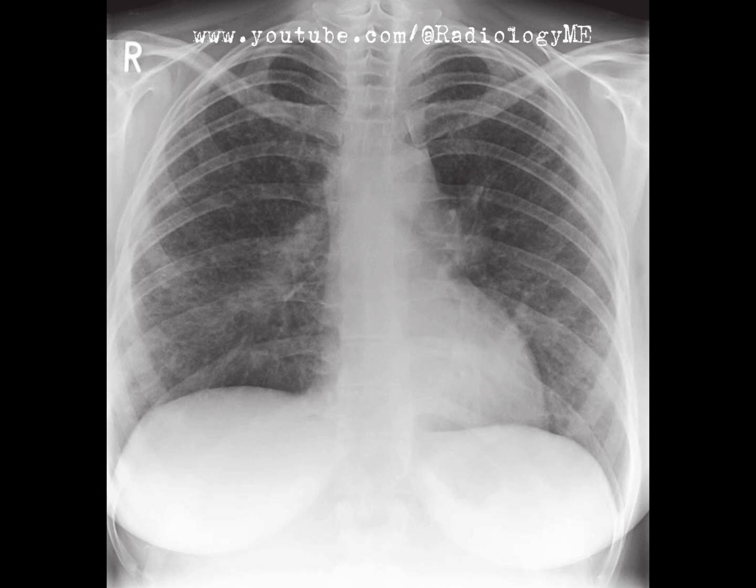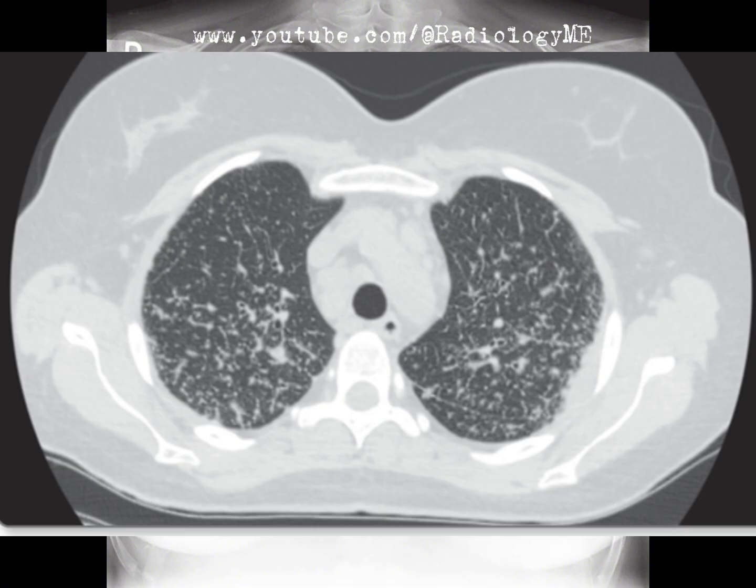The heart size is normal, no signs of cardiomegaly to complicate things further. So based on this plain film alone, we've got a case of interstitial lung disease with hilar prominence, but without any obvious consolidation, cavitation, or pleural effusion. Interesting, right? Let's not forget to cross-check the accompanying CT.